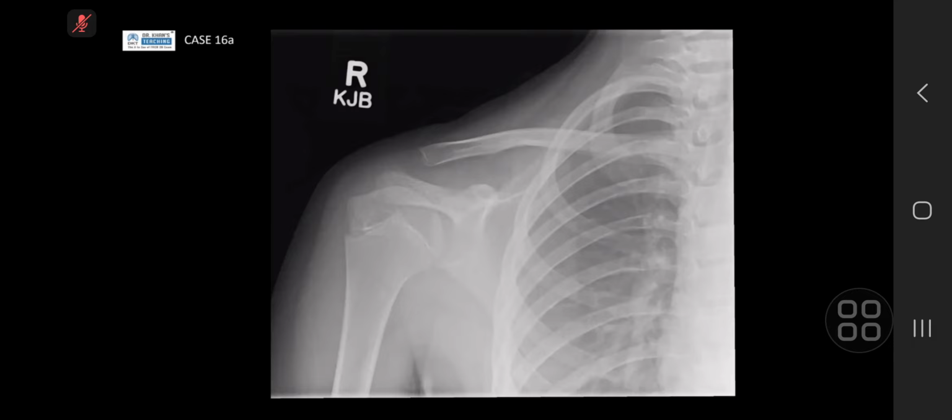Okay, I'm looking at the bone to check if there are any bone abnormalities. I can see a widening at the space of the right acromioclavicular joint. The right humerus looks good. The epiphysis. The ribs, the trunk.